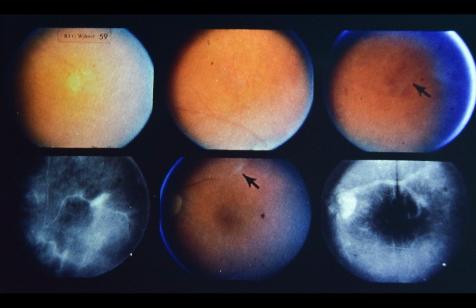This 26-year-old white male presented in May 1975 with bilateral vitreous hemorrhage and good visual acuity. Initially, fundus details in the right eye could not be photographed because of diffuse vitreous blood, upper left. When the media cleared 1 month later, photographs above the right disc, upper center, and upper right showed marked attenuation of retinal vessels, retinal and vitreous hemorrhage, and perivenous sheathing.